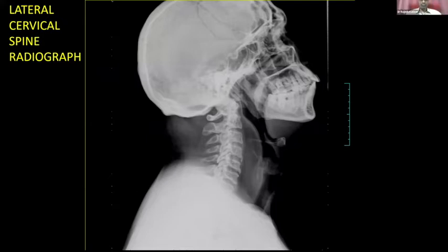Could be a lipoma. The retropharyngeal space usually has fat and nodes in the suprahyoid segment, so whatever involves fat and nodes can be there, whereas the infrahyoid usually has only fat, sir. So depending on the content, we can predict the pathology, sir.